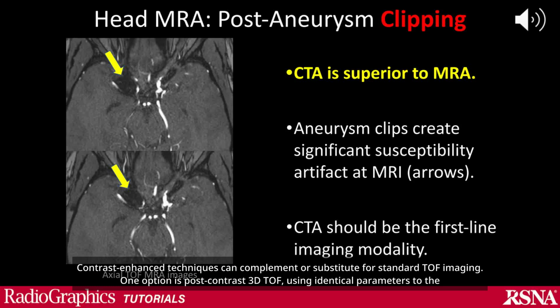In this example, contrast-enhanced MRA shows venous opacification, mimicking an attenuated MCA branch. However, comparison with non-contrast TOF confirmed that this was a normal intracranial vein.